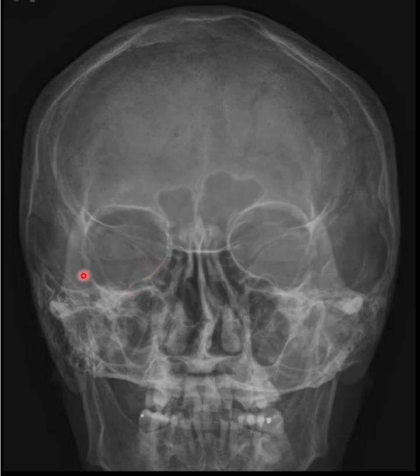All right, now moving on from that, we can go ahead and identify some other structures. We've already looked at the parietal eminence, we looked at the vertex, we looked at the mastoids. Now let's go in the center here. We can see the crista galli of the ethmoid, crista galli there. We can see where the cribriform plate of the ethmoid is, just inferior to the crista galli. All of this area in here is ethmoid. This is the perpendicular plate of the ethmoid meeting up with the vomer to create the bony nasal septum.